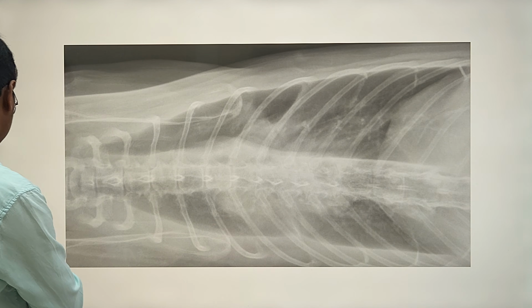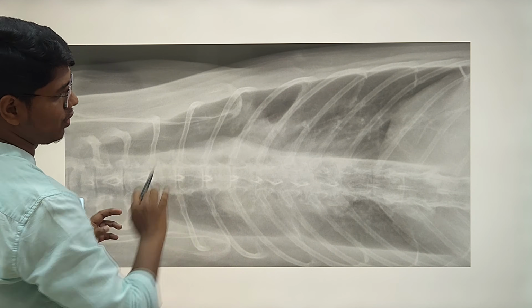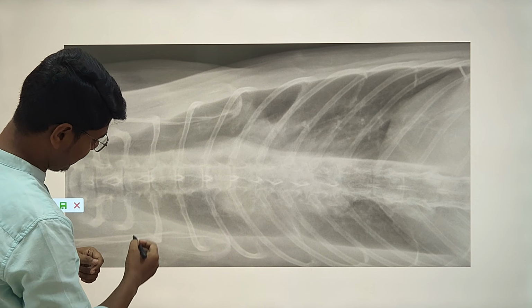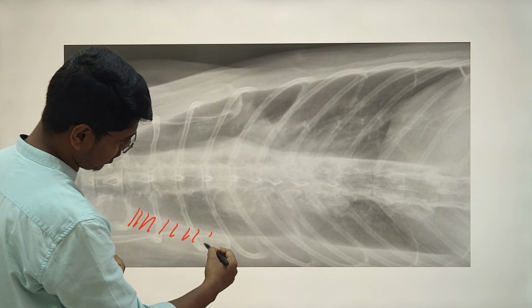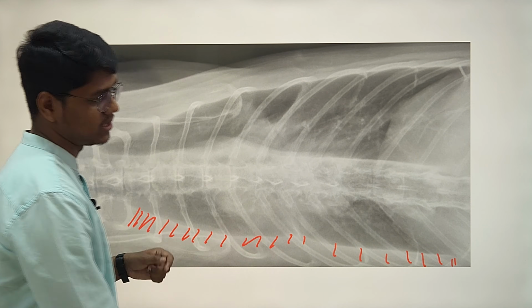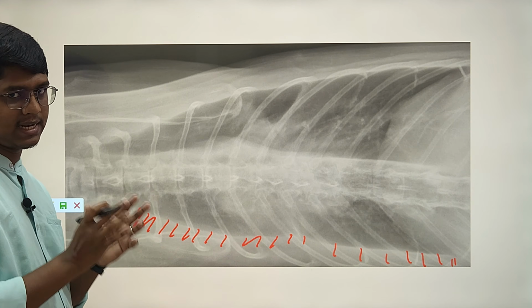So this one is the horizontal radiography in lateral recumbency. You can see that the non-dependent lung is completely fine. Okay, it is attached to the thorax, but what about the dependent one? You can see that the lung is retracted because of fluid accumulation. Okay, this is lung retraction. This is the sign of pleural fluid, especially when the pleural fluid is less.